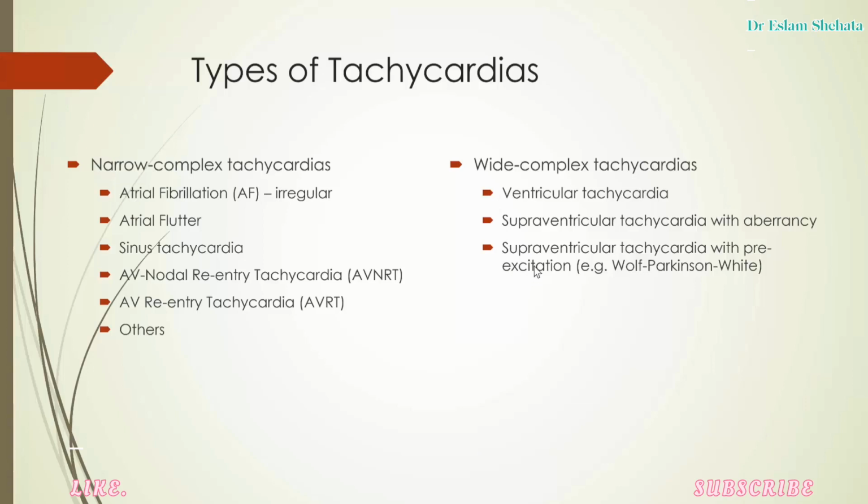As our final example over here, we've got supraventricular tachycardia with pre-excitation. So in certain circumstances, Wolff-Parkinson-White syndrome, for example, can give rise to a wide complex tachycardia, but we'll talk a bit more about that in a different slide.